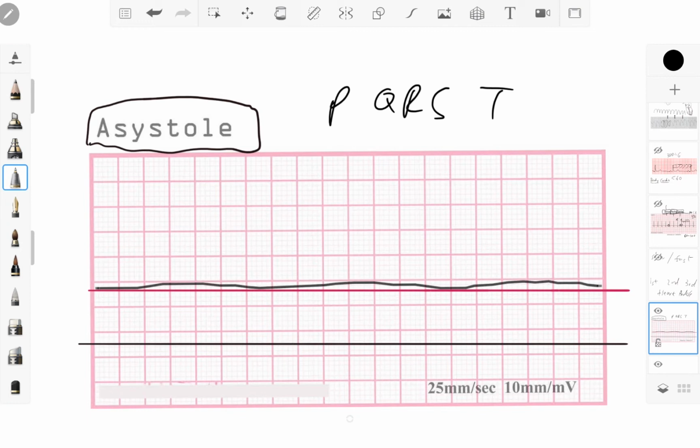If you see this on a patient, it means the heart is doing nothing. There is no activity. The heart is dead. Sad, but that's what a dead heart sounds like. And it goes beep. I can put a noise here so you can see what it sounds like.